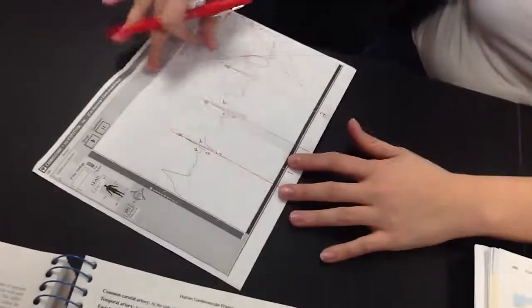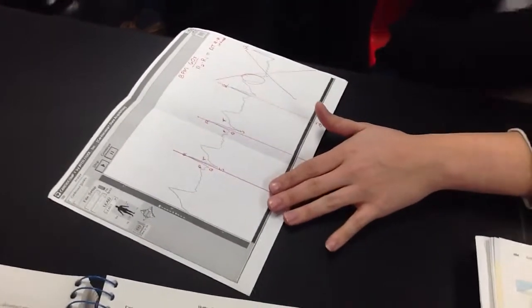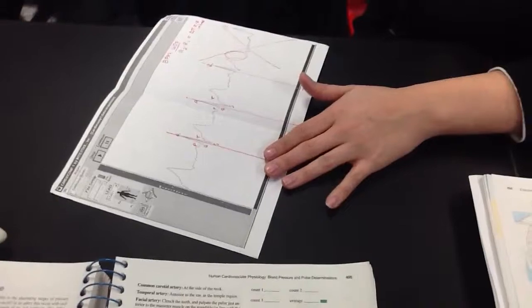Anybody lost? No? Okay. Alright, so we have this. So just to keep it easy, we're just going to do the tenths of a second instead of making you guys do some in between. Does anybody have a calculator on them? Okay.